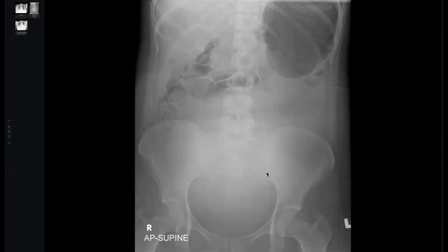As the fetus vertebral column is shown here, this patient wasn't given any apron. This is a fatal mistake. And she was not even asked about her last menstrual period or any possibility of pregnancy.